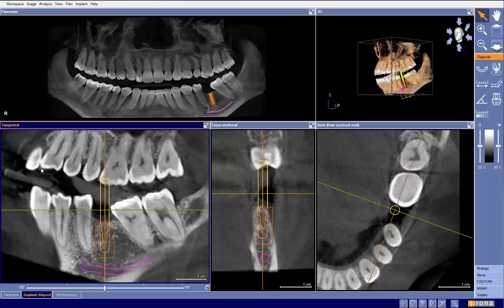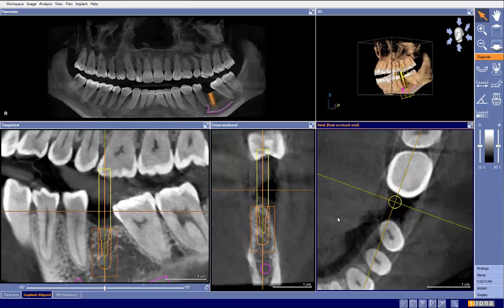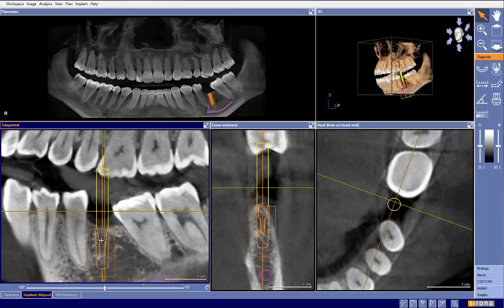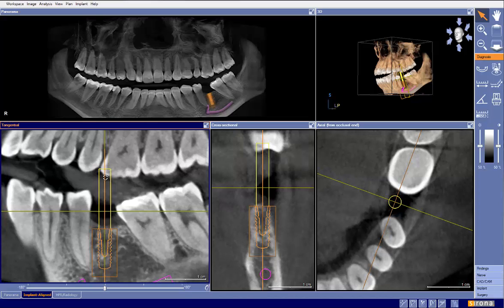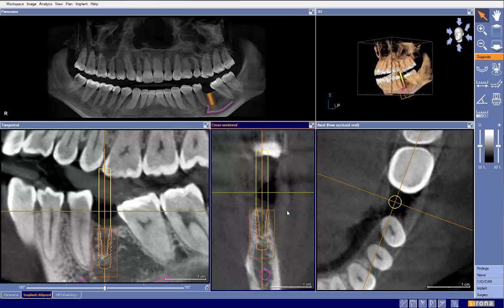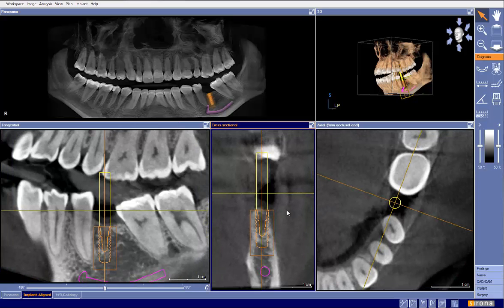Now, if we take a look at this, this looks more like a natural occlusal scheme, what we would want the implant loaded onto as we're biting. But in having tilted that, that brings us way closer to the distal. So now what we may have to do is move the implant over slightly. Now we're more centered, and maybe we'll have to cheat and off-axis load just a little bit, but that would look more like my ideal placement, something along these lines.